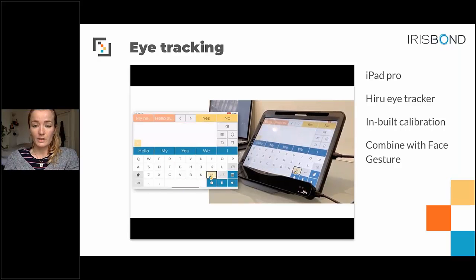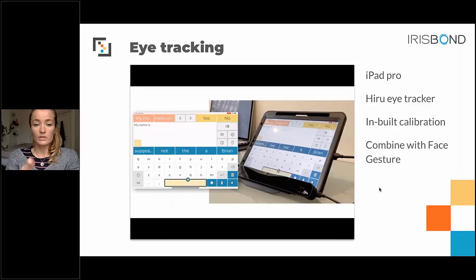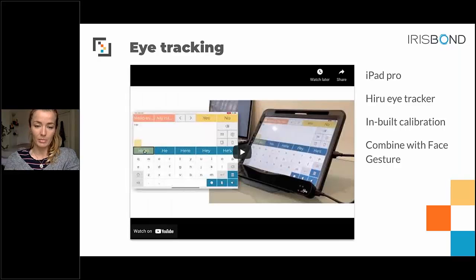If you have eye tracking on dwell duration, as it is at the moment, you just need to point at the different keys on screen with your eyes to select them. And as soon as you open your mouth or blink, you can also trigger a quick sentence such as "help me please" or "I need help" or whatever.